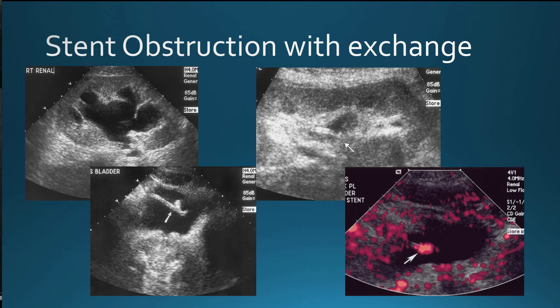So be careful being overly sensitive regarding hydronephrosis, really, unless you have a series of old studies that you're comfortable with, showing the baseline appearance of the collecting system. The appearance of the collecting system is difficult to hang your hat on. One thing that can be done, however, is evaluation of the distal aspect of the stent.